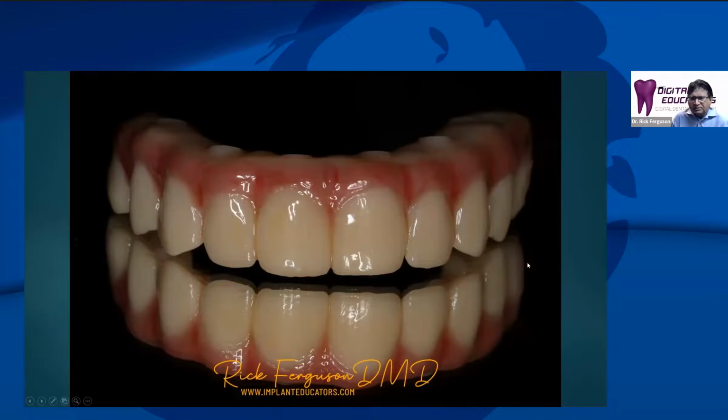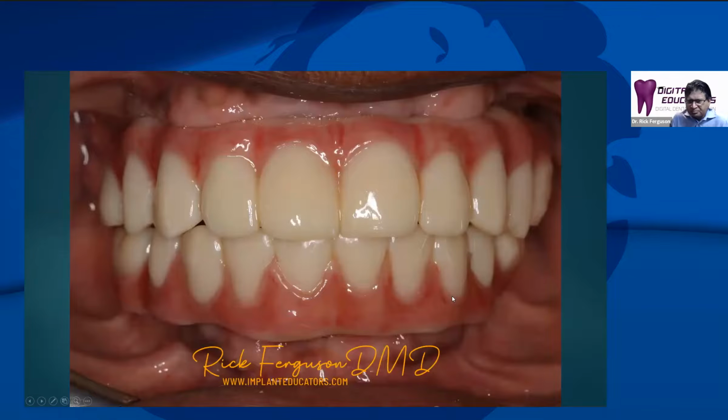But this is the prosthetic we designed for him as the second prosthetic after the first one that was put in at the time of surgery. And this is one we used to refine the aesthetics. And you can see it's much better than the denture that we had first designed. So this case was done in stages at our implant continuum. And then once we got the final prosthetic design 3D printed and the patient accepted it, we went to zirconia on that case.